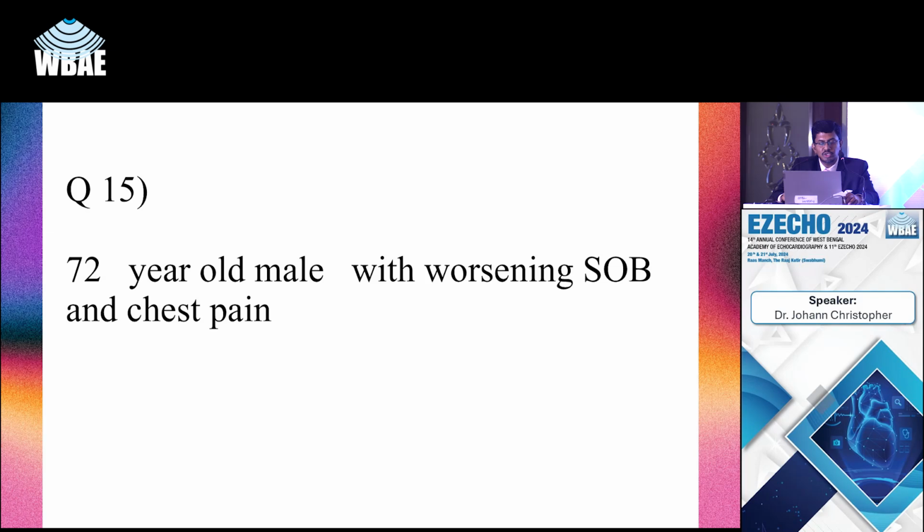So which is the most optimal? Remember, I showed you only the cine images in this particular patient. Most of you would have guessed that this is a HCM patient, but please look at the answers carefully.